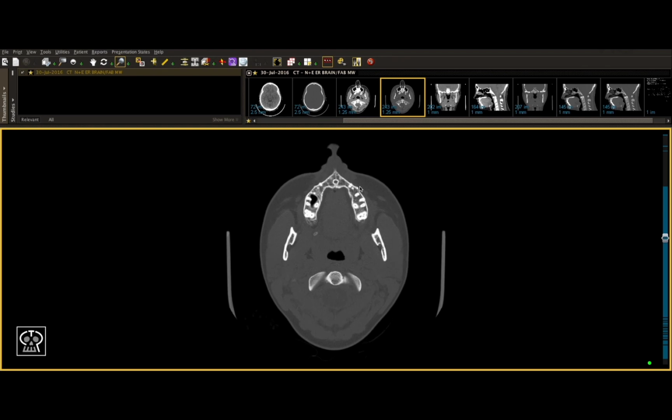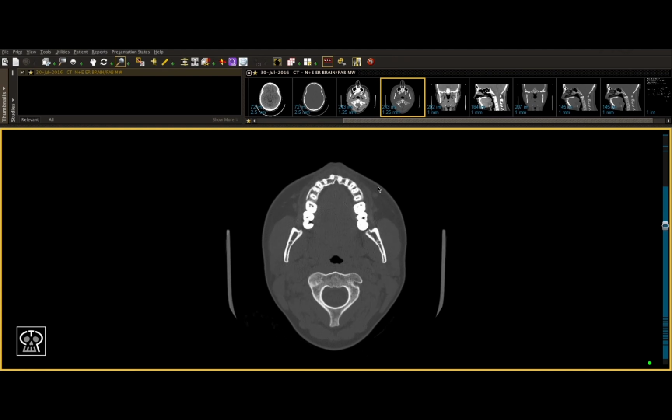As you're scrolling through the teeth, you'll be able to see breaks in the cortices that may represent an alveolar fracture. Right away at the anterior, you can see this divot in the maxilla that eventually, as we scroll up, forms a hole. This is an example of correlating with your known anatomy. As you can tell, this hole is posterior to your two central incisors, and as you guessed, it represents the incisive foramen and is a normal structure that you'll see.